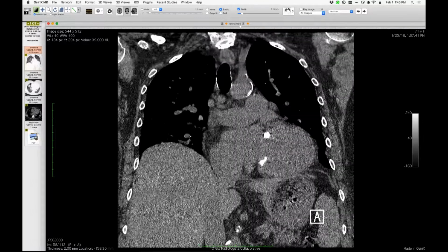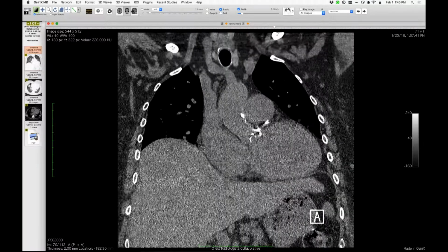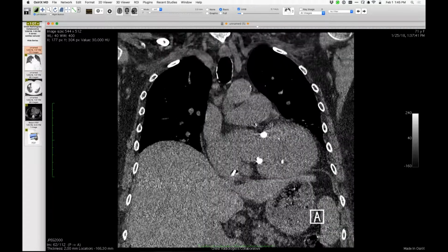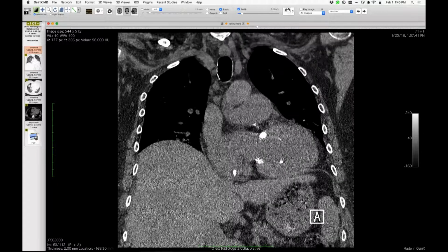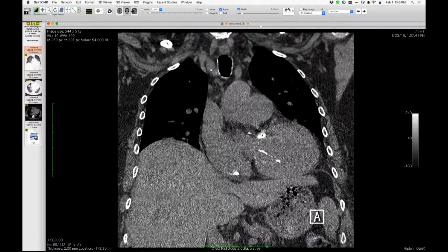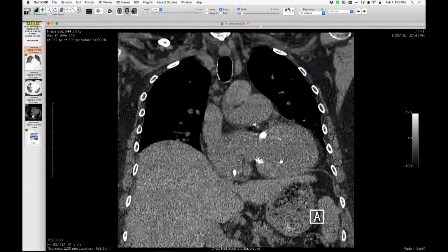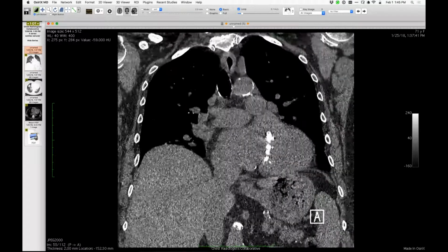Yeah, they were described as calcifications in the leaflets as well, in the ultrasound report. And I think that some of that is too far from the valve plane to be just leaflet. So maybe some, but I think some of that may just be chordae as well. It also looks very elongated. It looks as if there's a string-like thing in some of those.